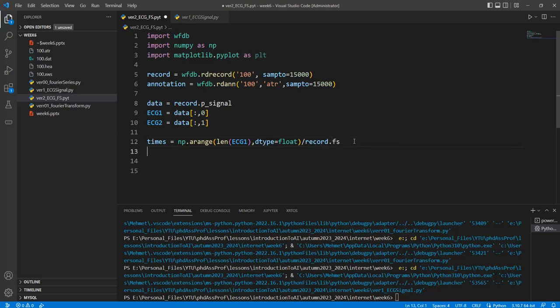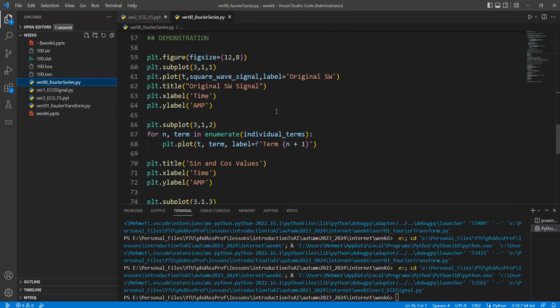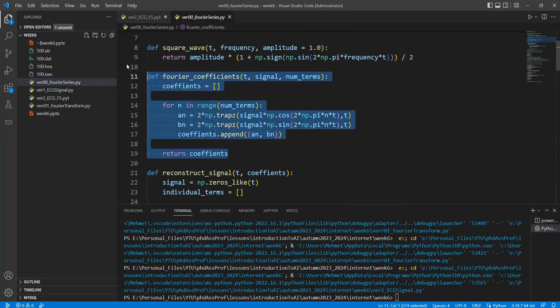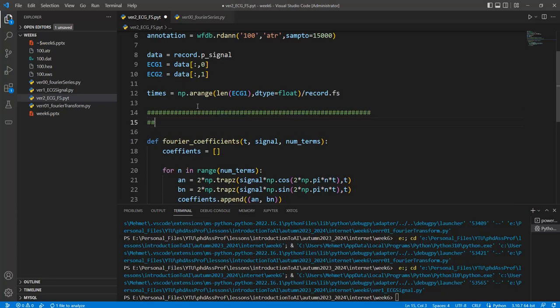so in order to calculate the Fourier transform, we can take the Fourier coefficients here, like this one. For example, where is my code? Okay, this code, copy it right now. We can copy this whole code. This code is not different from the others. Okay? Function definition.